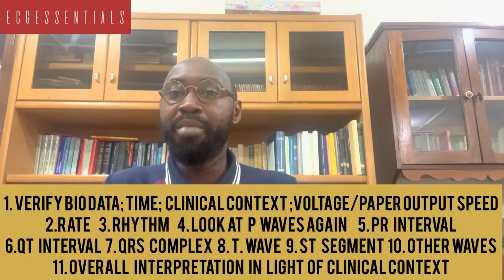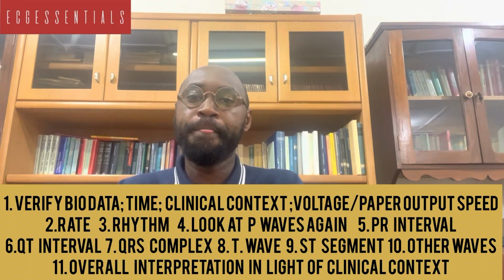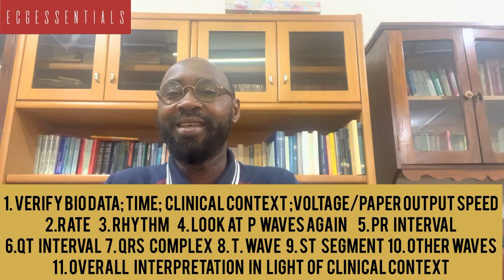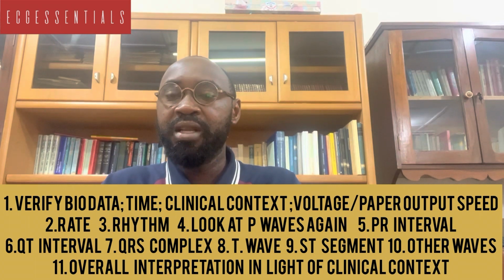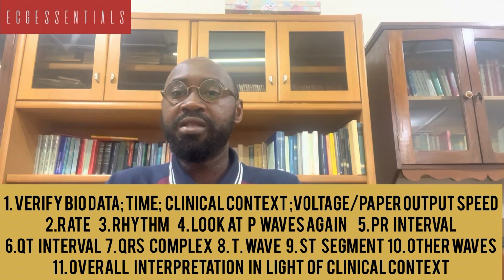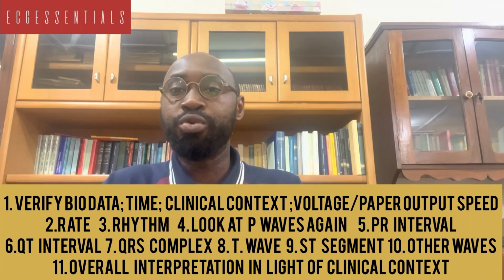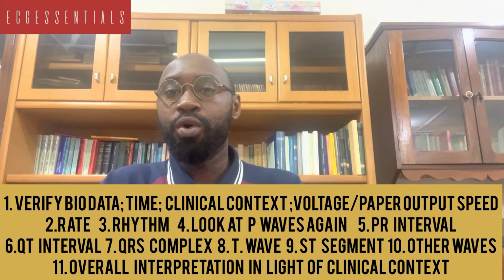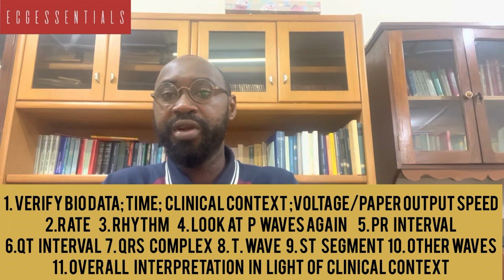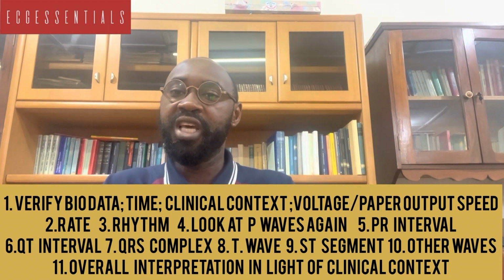So in our approach, the first thing of interest is to verify the biodata. When you have done that, you look at the rate, then you look at the rhythm. Then you come to your P wave, then your QRS, your T wave, then you look at your intervals, the PR interval, don't forget your ST segment, don't forget your QT interval.